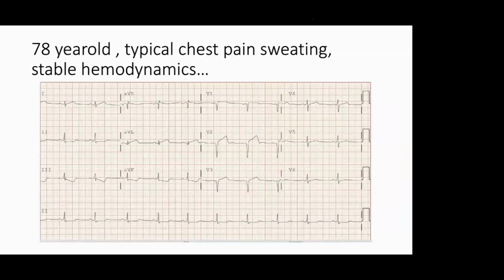This is another case. Can you tell this ECG? This is a very simple ECG. Why is this ECG put? Because of risk stratification, whether we want to thrombolyze the patient or not. In this case, that's the question.